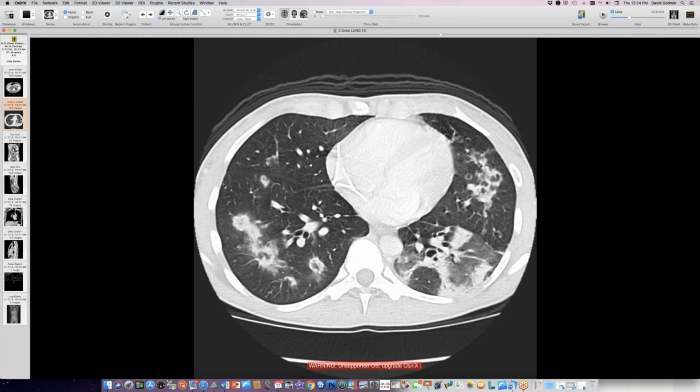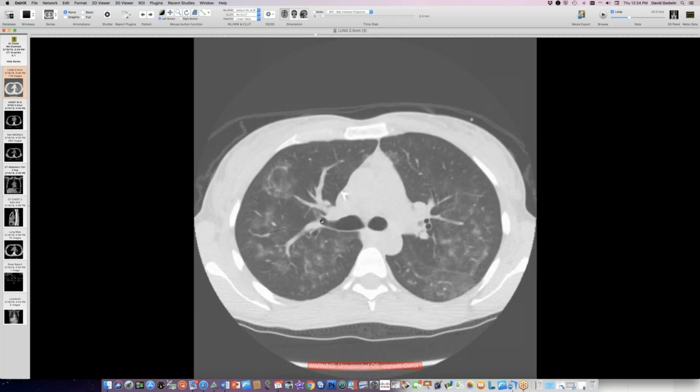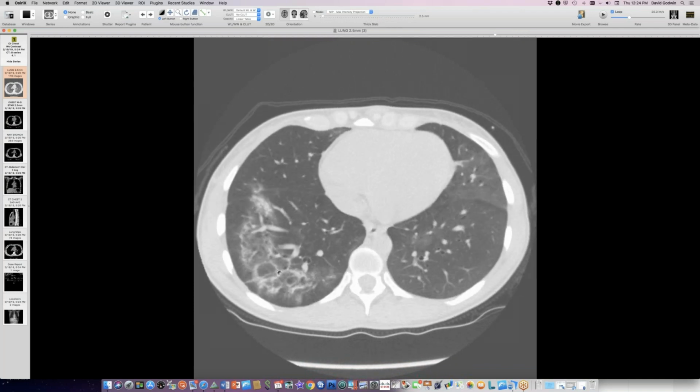It's idiosyncratic, David. I've seen it on people who've been on a long time, short time. It's like amiodarone. It can happen early or late. Right. Okay. And then here's what it looked like 1 month later, and they hadn't withdrawn the drug, but you can see that the pattern has evolved, and we now have this perilobular pattern of evolving organizing pneumonia.